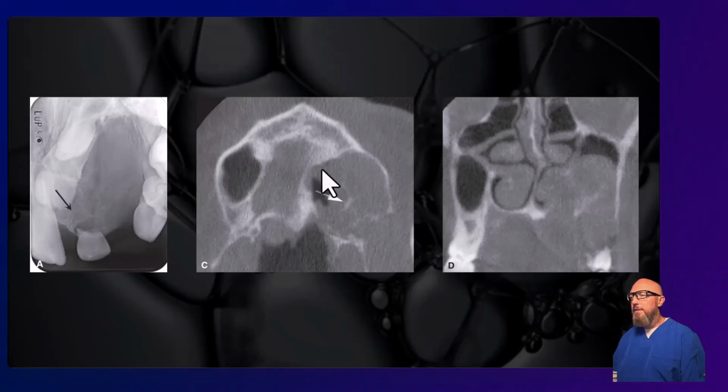Let's look at these CT images. So an axial slice through the maxilla, we can see a healthy maxillary sinus on the right side. But then this expansile, opacified area with some calcifications internally doesn't have that really nice demarcated multilocular appearance, but more granular septations. I believe this is the same case in the coronal view, where you can still appreciate those wispy septations.